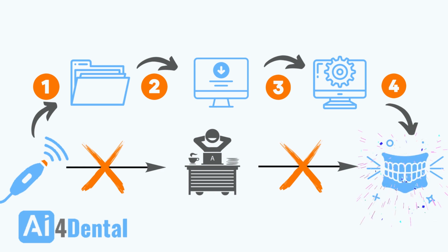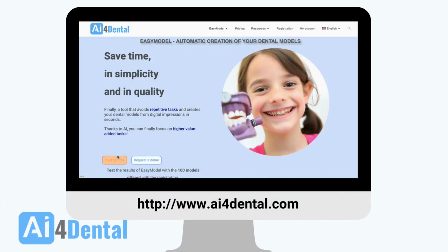After only 1 minute, your model is ready to be downloaded for printing or as a basis for your CAD work.